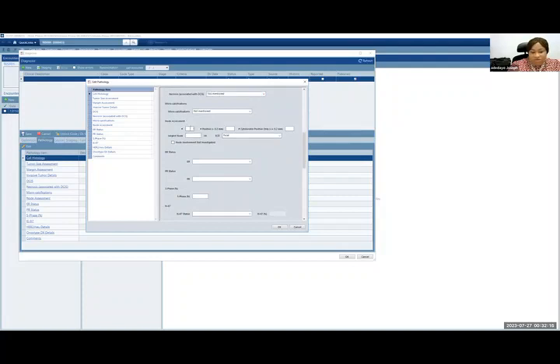When we get to the nodes, we're assessing the nodes. This is again only possible with a post-mastectomy or maybe a wide local excision, but they've done an axillary sampling dissection. How many nodes were removed? Number of nodes removed in total. So 11 lymph nodes were taken out in total. How many were positive? 5 nodes were positive. Cytokeratin positive only. If it's not mentioned, you leave that place blank. What was the size of the largest positive node? The largest positive node was 2 centimeters.